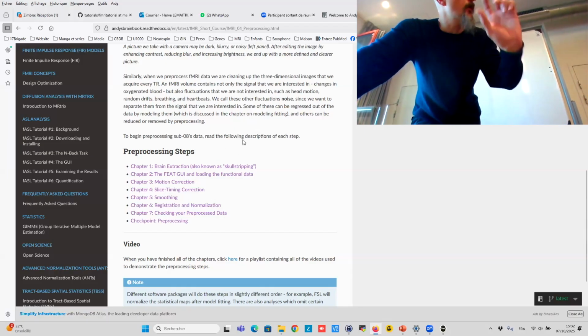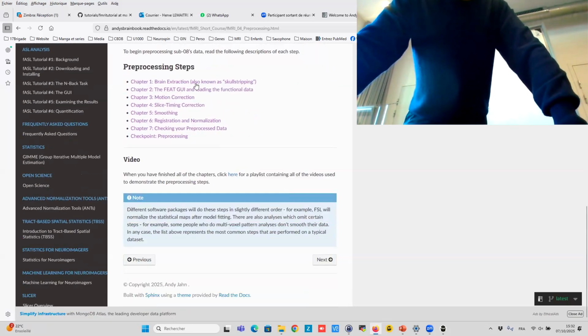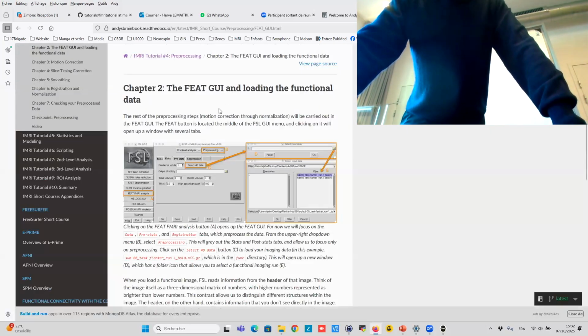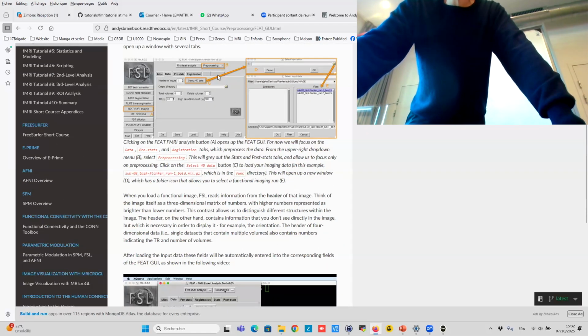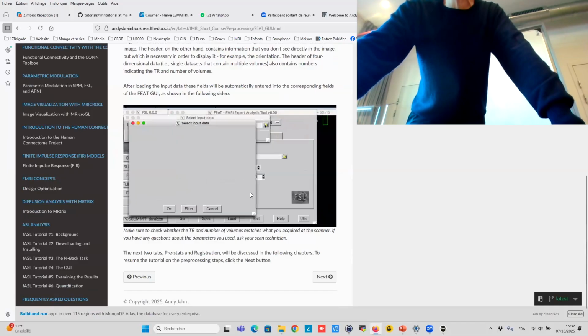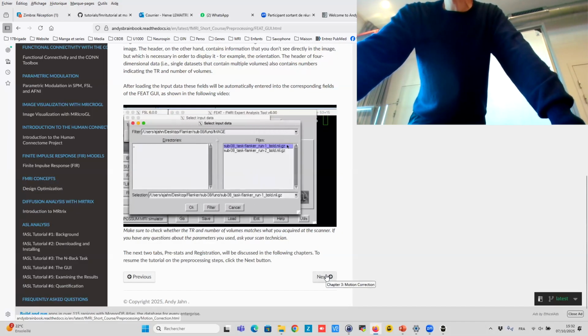There are different options you can use, so there are different chapters. We did the brain extraction tool. And let's see what we did with FEAT. Again, everything is explained how to do it. If you are confused, there are even videos. It explains everything, so it's really, really well done.